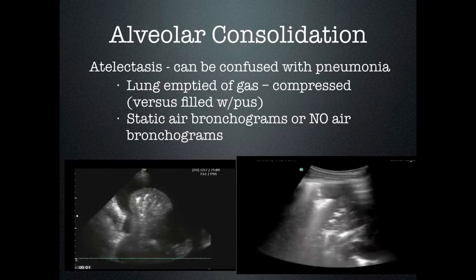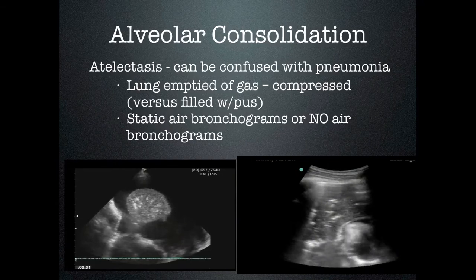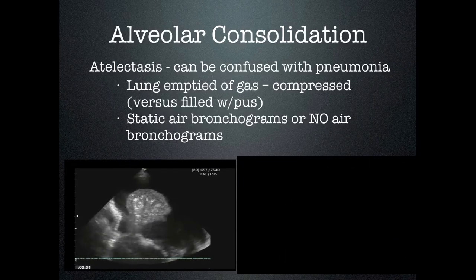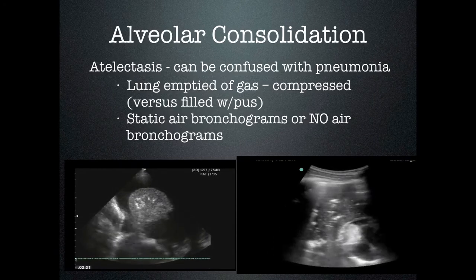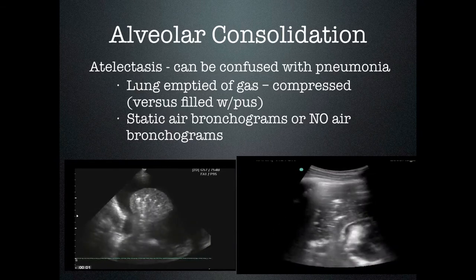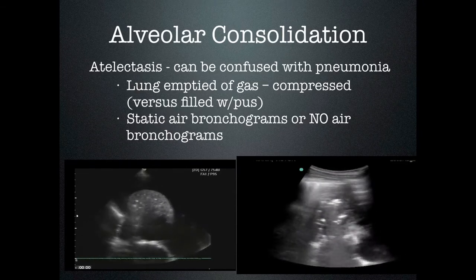In obstructive atelectasis, the ultrasound image will demonstrate a scant pleural effusion generally, and the hypoechoic lung consolidations and focal lesions will lack movement during inspiration and exhalation. In other words, in a pneumonia, there is pus in the bronchioles, and it will move with respirations. This is called an air bronchogram, and the pus is moving in and out of the air bronchogram.